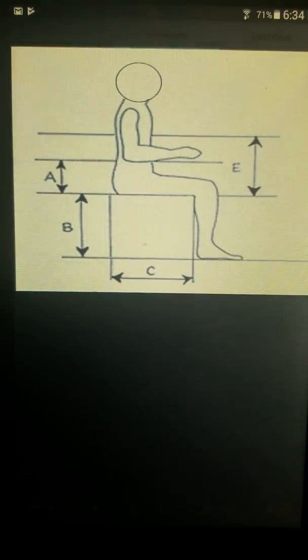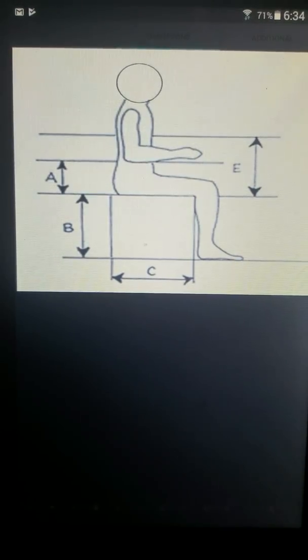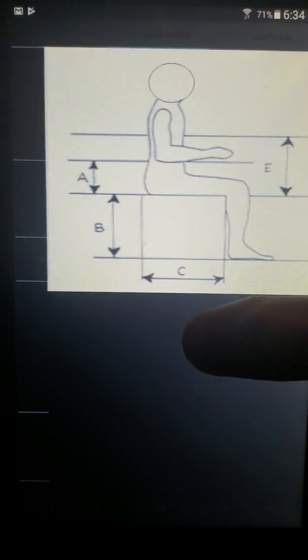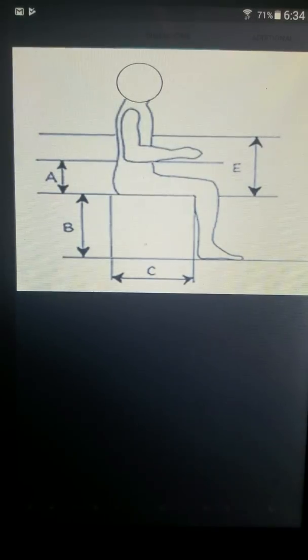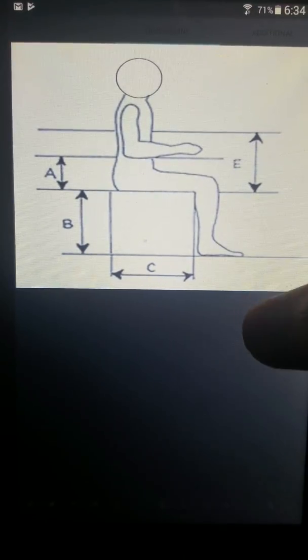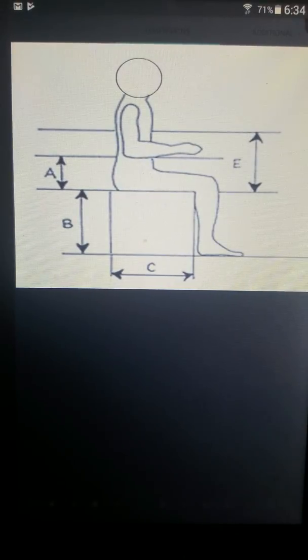As far as the dimension section, right now it just gives you an image of what you would typically need to measure. There were measurements at the bottom that described what A was, what B was, what C was. I kind of ran into some technical issues there, and they will be added soon. And I actually want to add a text box for each one, so you can actually list them, just to make it as easy as possible for the therapist.